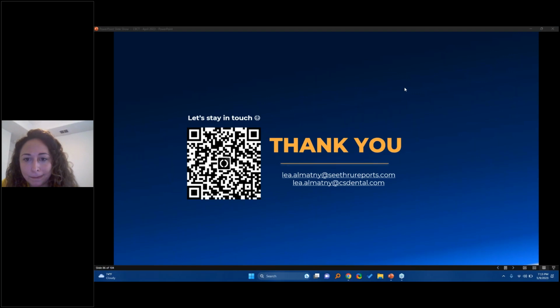It was asked earlier, it could be the thickness of the slice, like if they're taking a super thin slice and they don't have metal artifact reduction, which I don't think they do. Metal artifact reduction would help, and thickening up the slice would make it a little more pleasant to the eyes. Not quite as diagnostic, but it looks pretty. Yeah. Thank you, Fran.